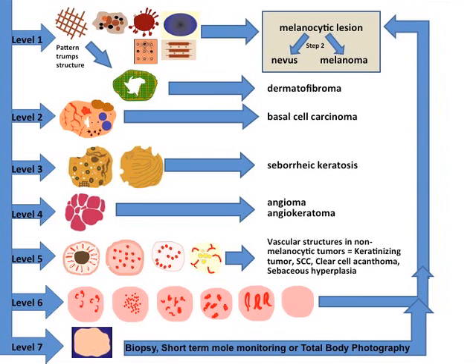We will talk about the non-melanocytic lesions in a moment, and if it's not a basal cell and a seborrheic keratosis and a hemangioma, and you have now no features of this lesion, you now need to look at the vascular structures, and depending upon the morphology of the vessels and their distribution, you can still classify a lesion as melanocytic or non.